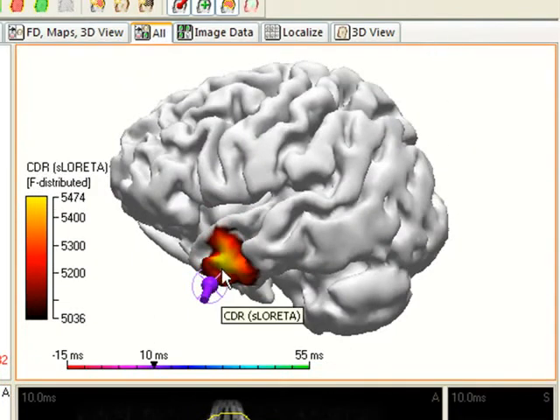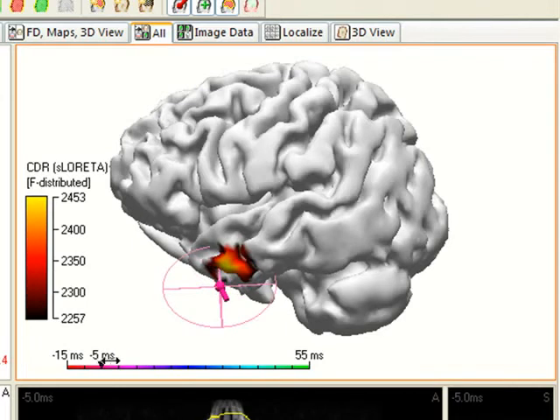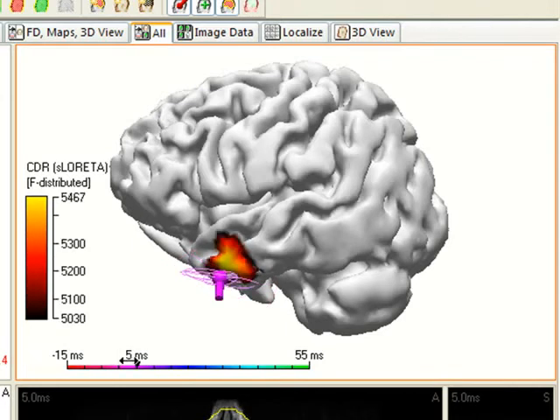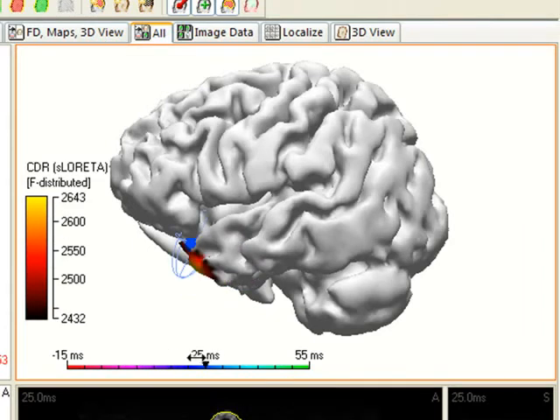And we can see that there's pretty good agreement. Let me just change from time point to time point, and you can see there's pretty good agreement between two very different mathematical approaches. So two different approaches are giving very similar results.